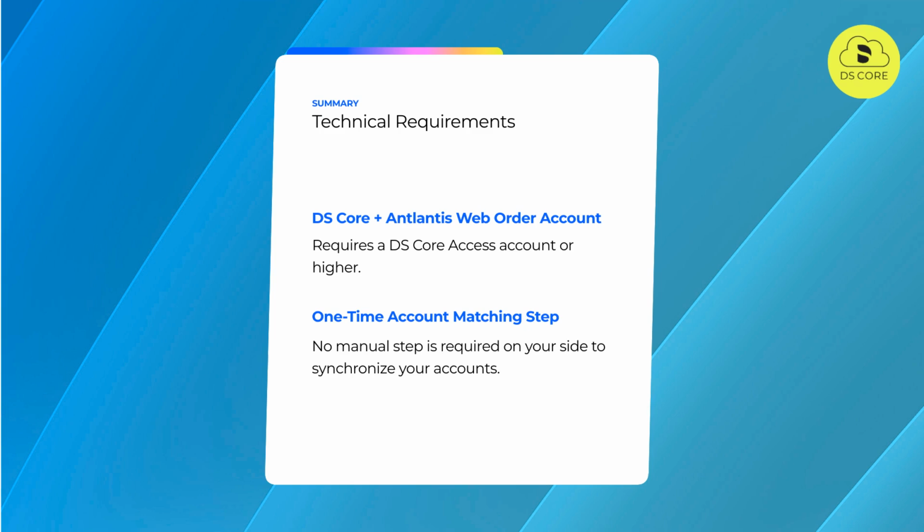When you hand over your first order from DS Core to Atlantis web order, a Dentsply Sirona customer service agent will synchronize your DS Core account with your Atlantis web order account. This can take up to 24 hours but is only required with your first order. No manual step is required on your side to synchronize the two accounts.